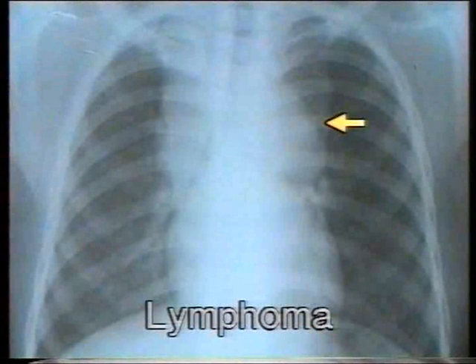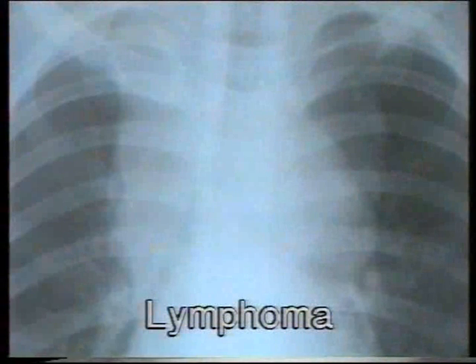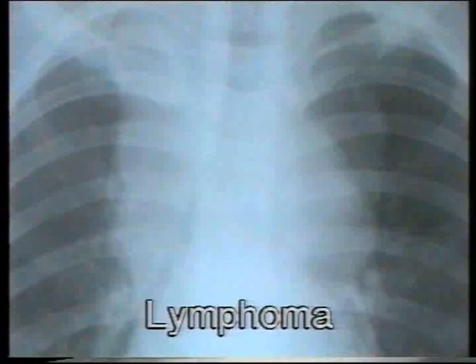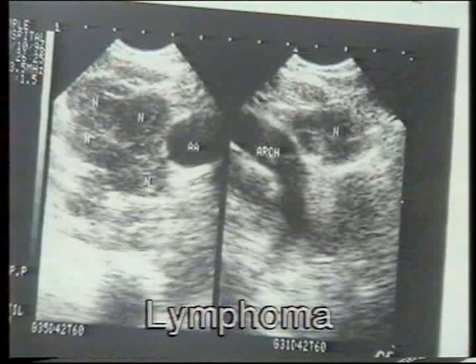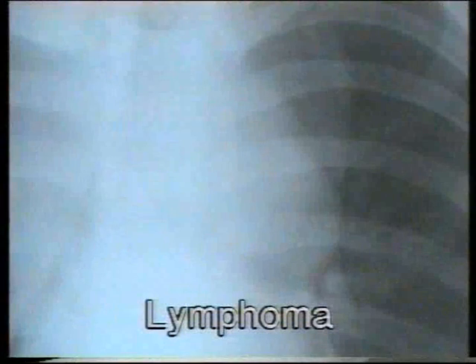This mediastinal mass, showing bilateral widening, has a characteristic lobulated border, especially on the left side. This is a lymph node mass. Such large and bilateral lymph node masses are almost diagnostic of a lymphoma. Lymph nodes of tuberculosis or metastasis never grow to such a large size. I also have an ultrasound picture of this patient taken from the suprasternal notch, showing the large and multiple lymph nodes surrounding the arch of aorta, thus confirming that this is a lymph node mass. Note again its typical lobulated border.